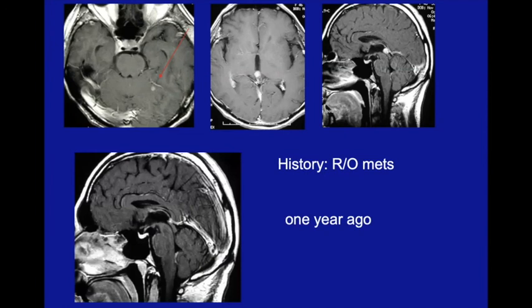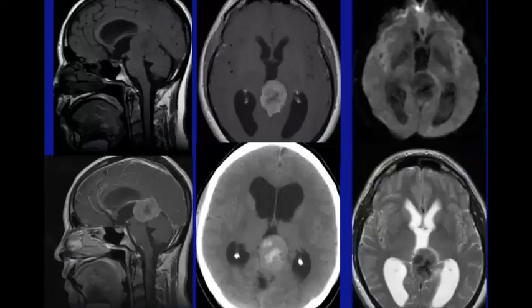And again, because normal pineal gland enhances, you can't use enhancement as a marker, but look for change in size if you have the opportunity to look at previous scans. If you think it looks a little chunky, as this one does, then I would suggest you follow it up. If there's any concern, it could be a pineal metastasis.